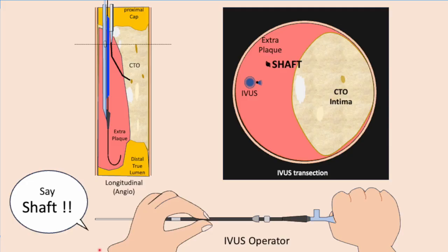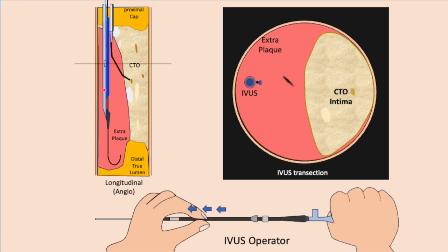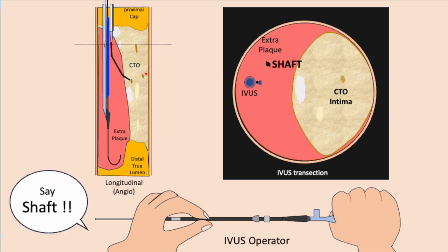So this is an animation of the tip detection method. Forward, then tip, back, and shaft. Okay, you can see we can do this repeatedly. We understand repeatedly. Okay, shaft and tip. This is the tip detection method.